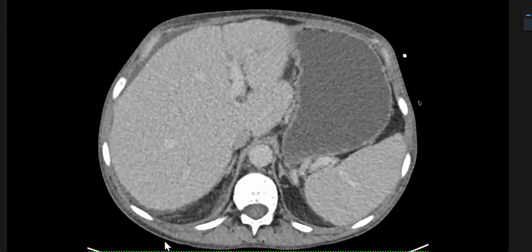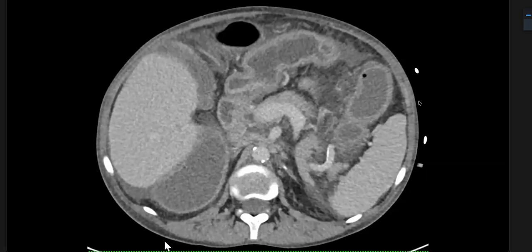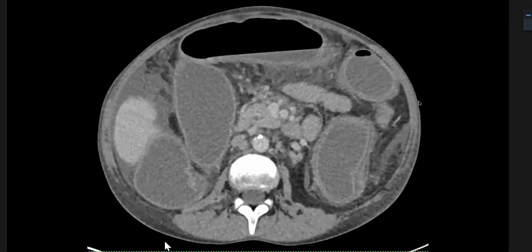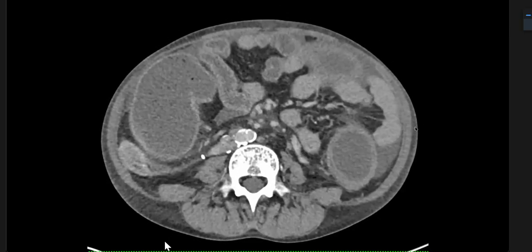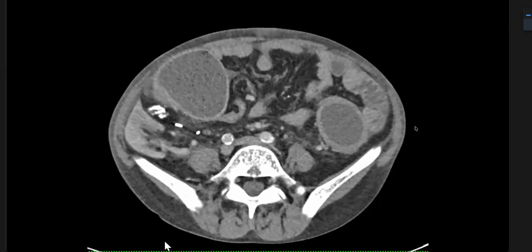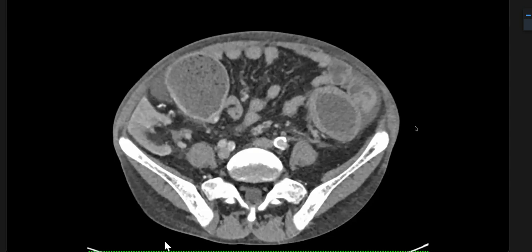There is an enlarged liver. The stomach is dilated as well, and there are significantly dilated loops of bowel seen. In the region of the right iliac fossa, I appreciated a chunky area of calcification posterior to and adjacent to the cecal region.